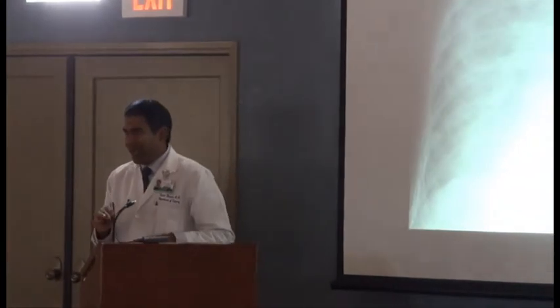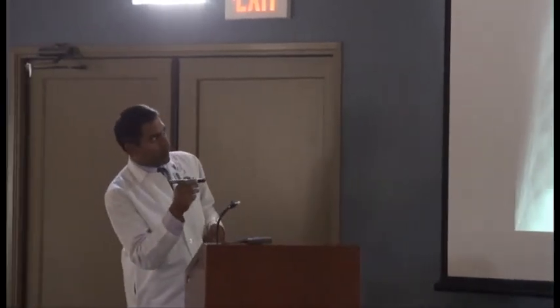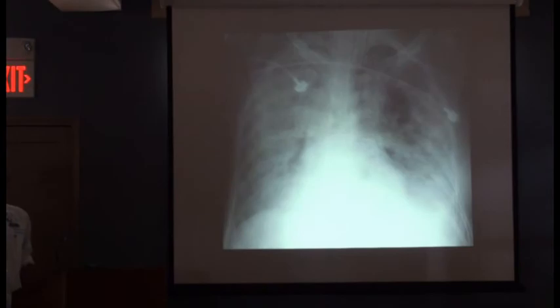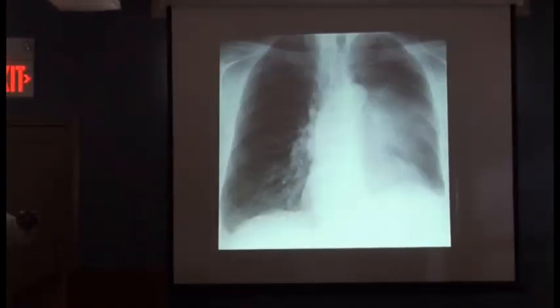Okay, again, I got to run here, but this is ABCDs. All right, so airway's fine. You can actually see this patient's intubated, which isn't surprising. Why is this all white? It's not trauma now. This is a patient in the ICU. Precisely, ARDS. Bilateral puffy infiltrations, not puffy vasculature or edema, infiltrations. This is just craziness all the way around. All right, and then this is just atelectasis right here.